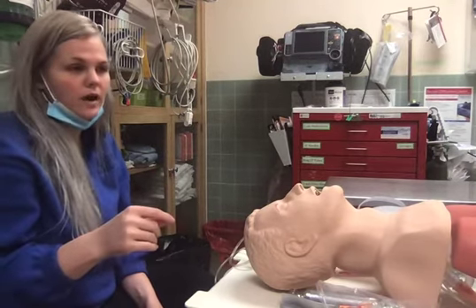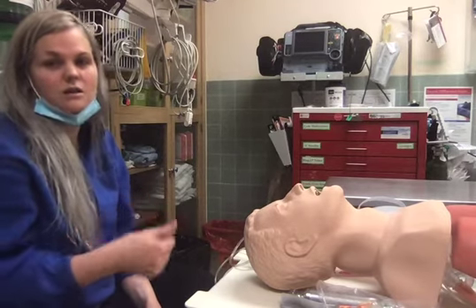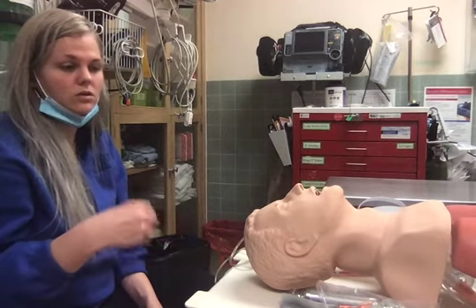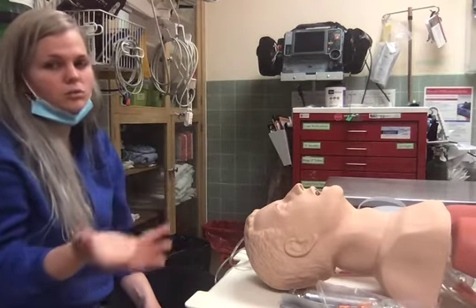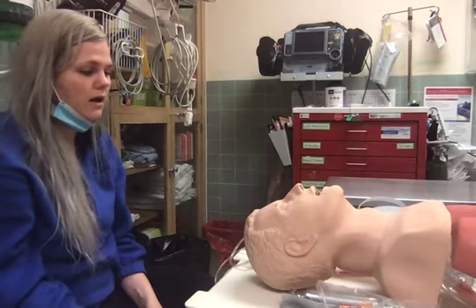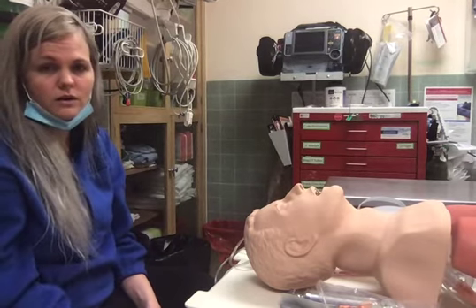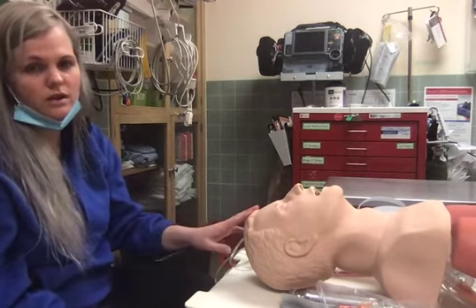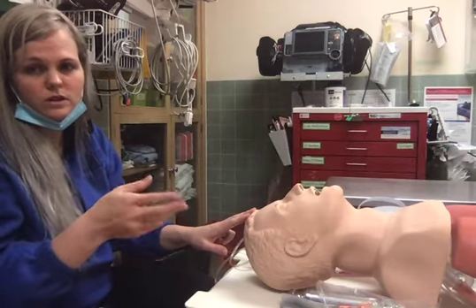So if you have a patient that doesn't have great lung compliance, you're going to need those additional pressures in order to gain control of that noncompliant lung. And so as the lung becomes more compliant, which generally it does unless you have an RSV situation going on, you will actually turn that pressure down as you transport. And so along with the pressure support and PEEP, you're going to set your respiratory rate and your FiO2 as you would in the volume assist control.